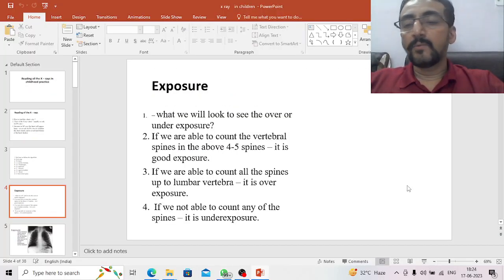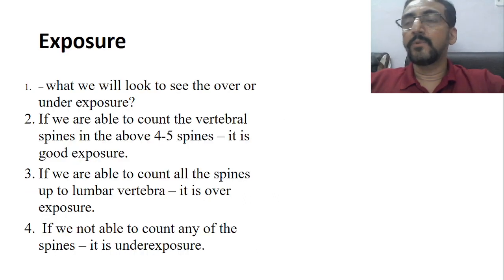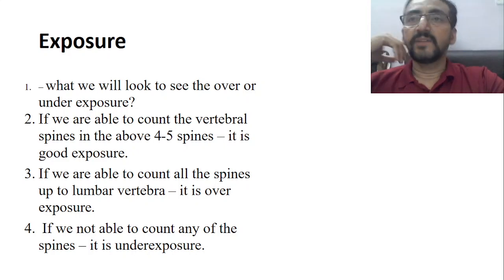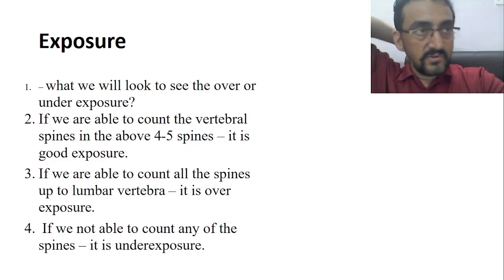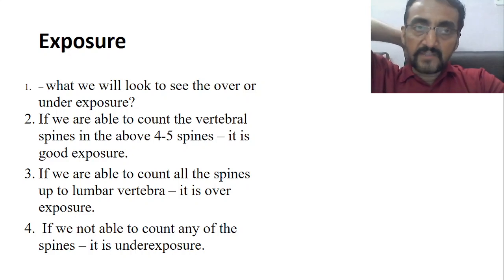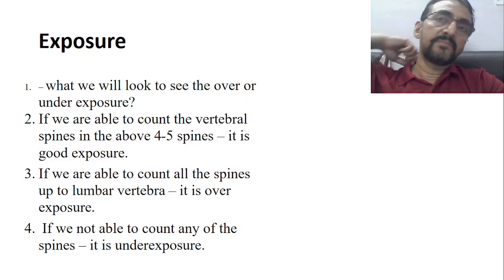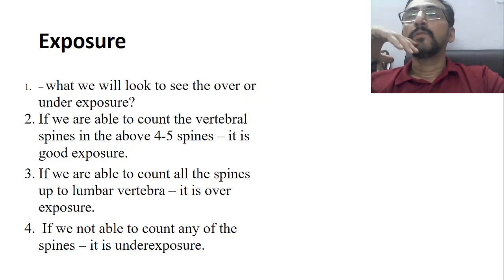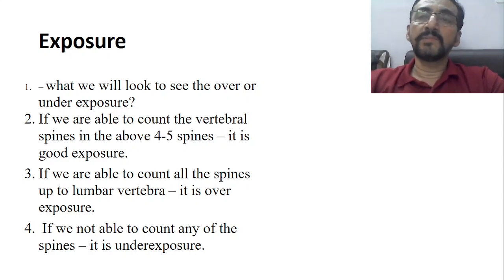Okay, so now we move on to the next important thing, that is exposure. Taking the X-ray, there may be some technical errors that are quite common when the X-ray is taken by an inexperienced person who is not an expert in the field of X-ray. Or sometimes it's very difficult to take X-rays in children because they very rarely follow the commands of inspiration, expiration, etc.